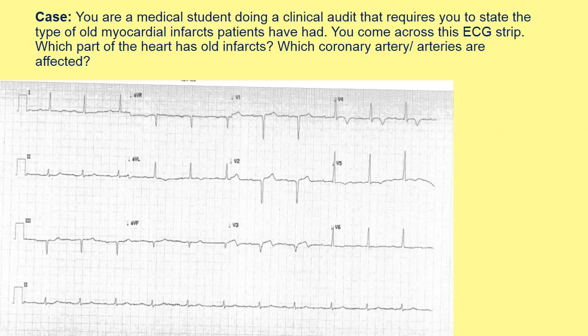And pause the video once again and try to answer this question. Okay. So where can you find Q waves in this ECG strip?